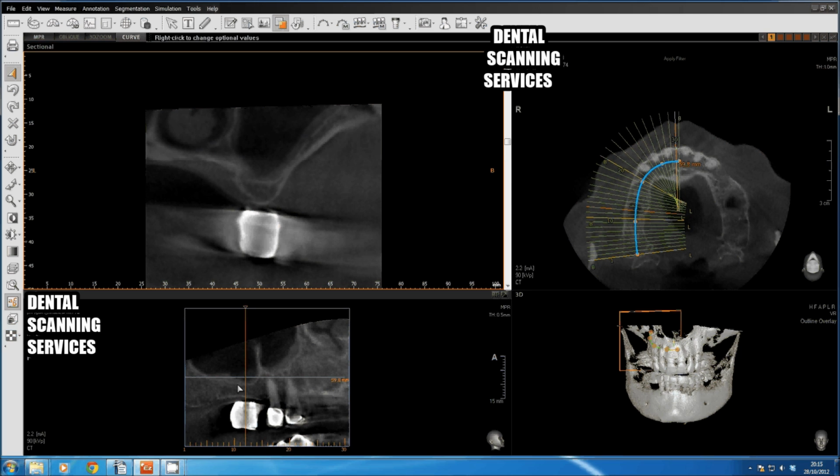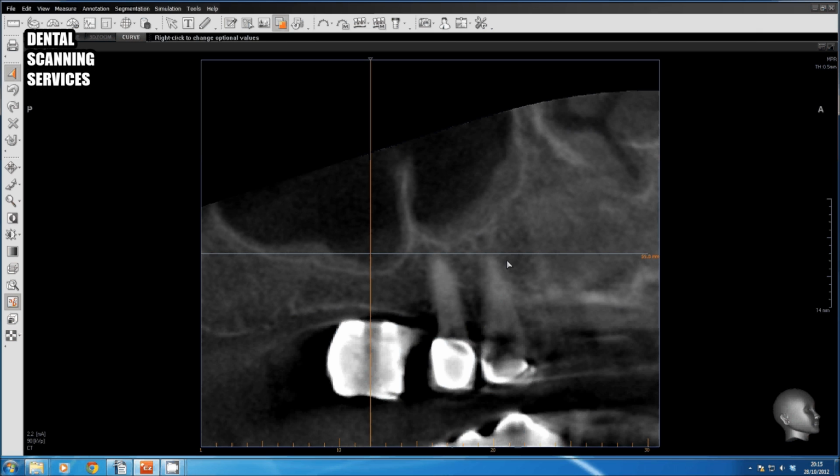The other thing that you notice is you've got a maxillary septa, and they're notoriously hard to elevate the lining around. To enlarge this picture, if you just go to the little button over here which looks like a sideways arrow and click on it, it makes this image the largest image, and you can see this area is quite tricky, and this is all part and parcel of the planning. In this situation, the implant can be placed here. You've got about 5 millimeters of bone here, and you've got adequate width.